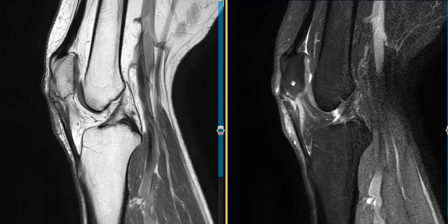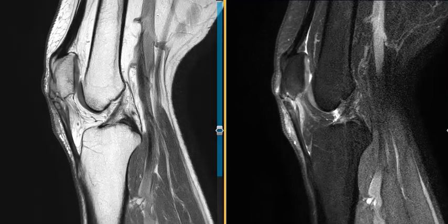When children get this during development, the growth plate along the bottom can become irritated, and rarely it will not fuse with the bottom, and I believe this is a case of that. We call that Sinding-Larsen-Johansson Syndrome, when they have chronic irritation of the bottom of the kneecap where the growth plate is. And if they rest, usually the little piece will become incorporated with maturity and become part of the kneecap. Rarely, as in this case, the little piece of bone here did not become incorporated.